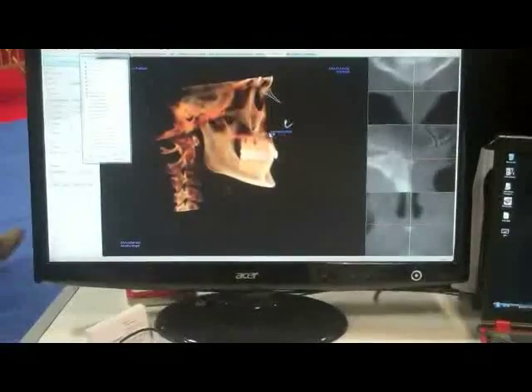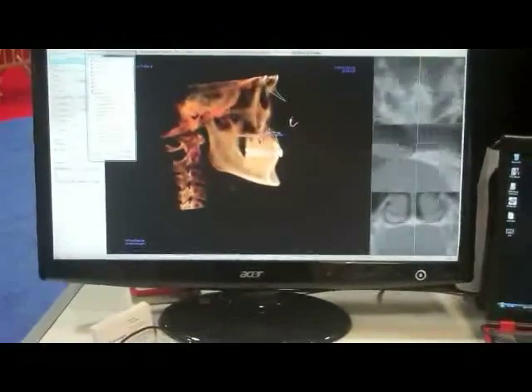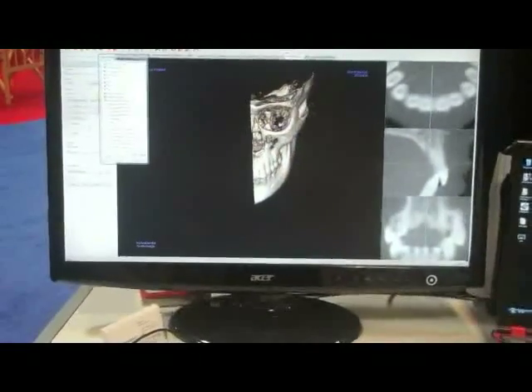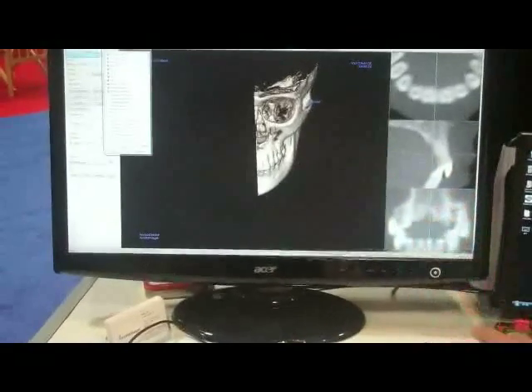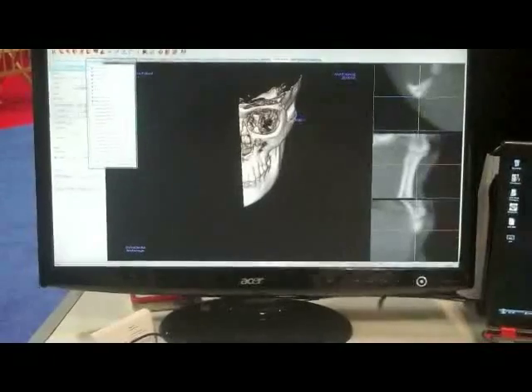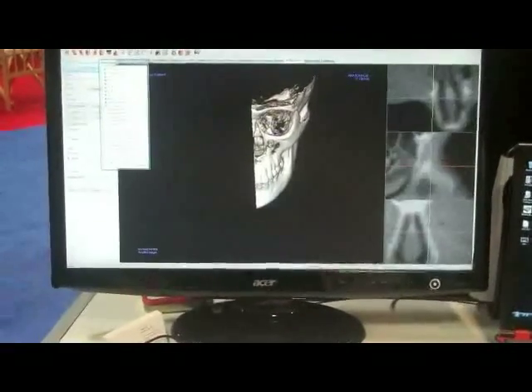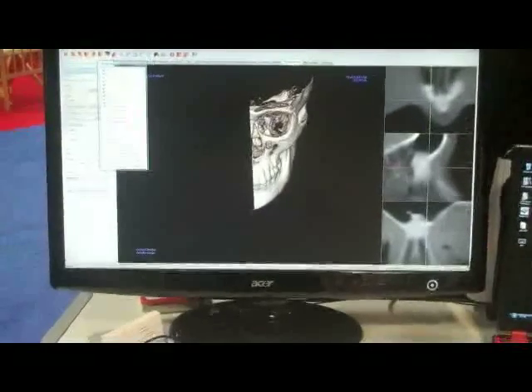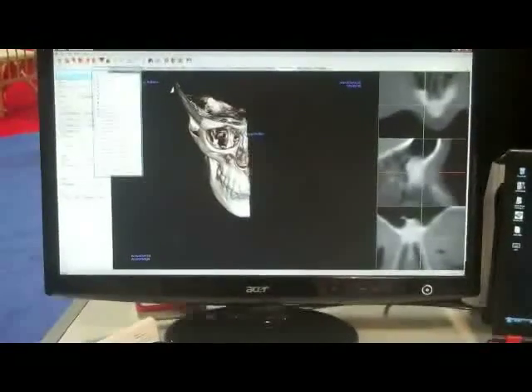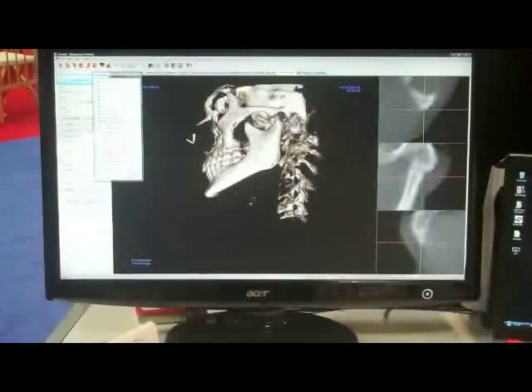And if you miss any one of these, you can actually go back and tweak all this stuff when you're done. Then just move right on to the next one. The nice thing is that when you place these points on here, it places it directly on the volume. So when I place this, it'll actually conform right to that scan, and then it will automatically calculate that tracing mark for you. Then we just go ahead and do the next one here. Click, move on to the next one.